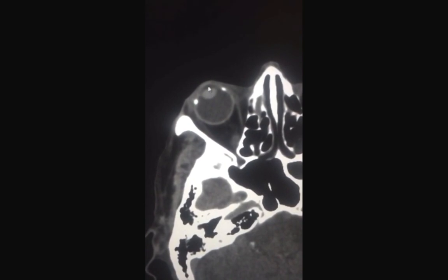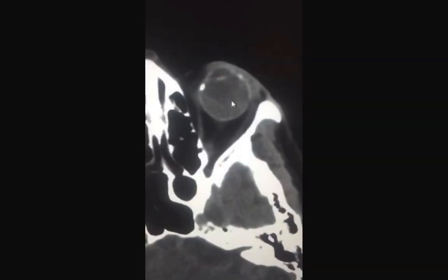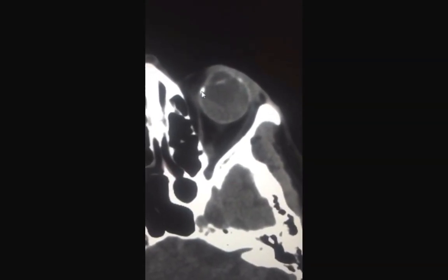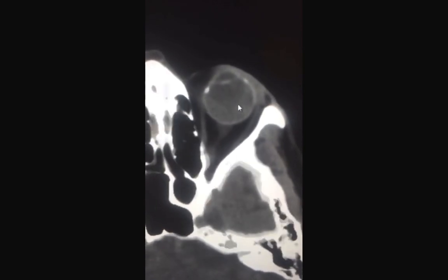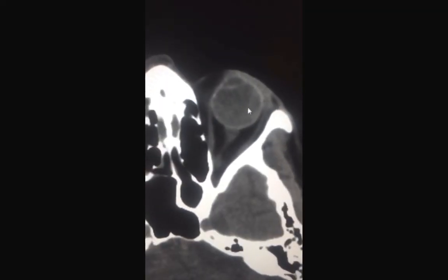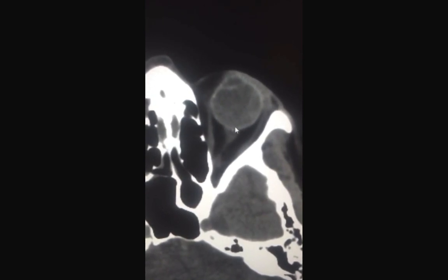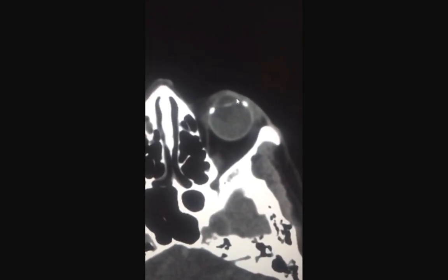So we quickly discussed the appearance of the normal hyperdense lens with the anterior chamber and the vitreous fluid, in addition to senile calcifications of the sclera. We understood the retina is confined by the ora serrata at 10 and 2 o'clock anteriorly, and that's why retinal detachment would have a V-shaped appearance. Another difference between retinal and choroid detachment is that retinal detachment would converge towards the optic insertion. Also remember that the absence of the lens should not confuse you, since this is a common post-surgical appearance.